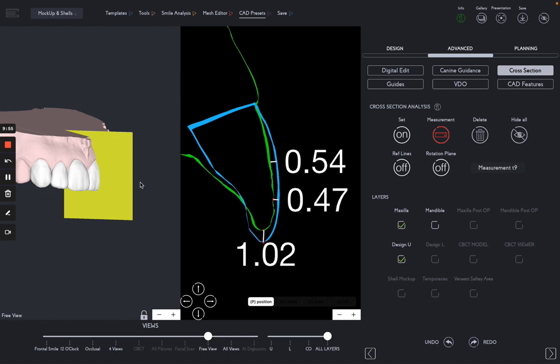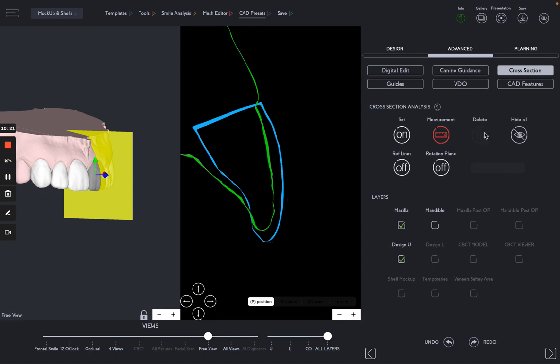Well, but what if you have to make some changes? Let's say if it's too thick or too thin. You simply click on the tooth itself, as you can see here on the left side, and then you will drag the tooth out however you want to do it. As you can see here, I'm dragging it out right now. So if I do that, for example, then my design, let me just delete this one and let me start over. My design here would be about 1 millimeter thick, okay?